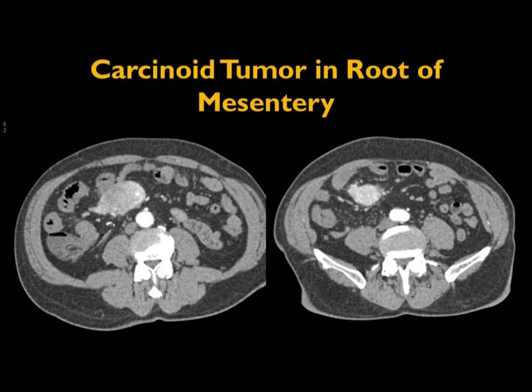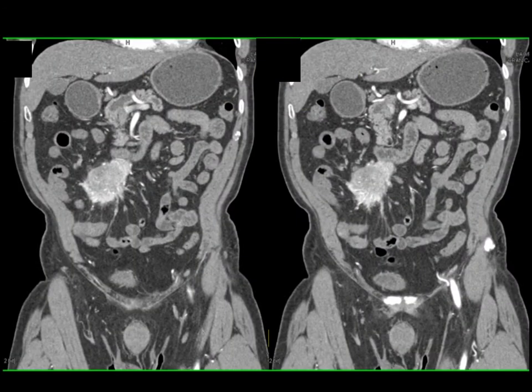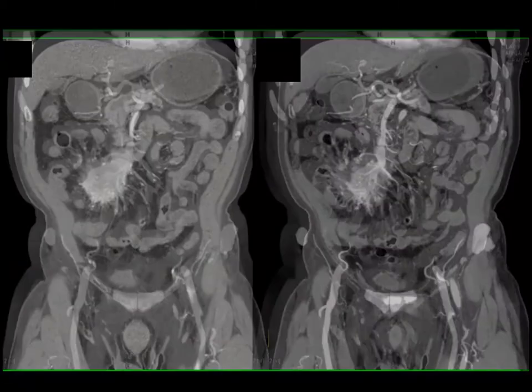Another example, a bigger mass, right of midline, enhancing. You can think of a desmoid tumor perhaps, but maybe it's enhancing too much. And desmoids typically displace. But look at this mass, and then look at it on the coronal view. Now you see the desmoplastic reaction. Now you see the vascularity. Now you see the encasement, if I go to the next slide, of the patient's SMV, which you cannot resect.